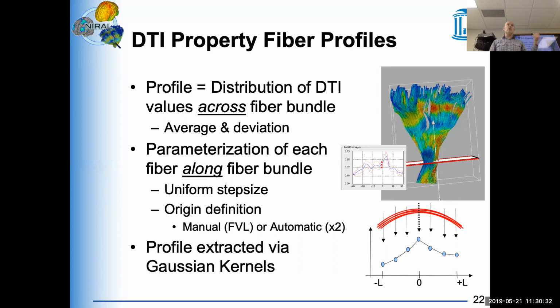We're doing a local Gaussian kernel that basically returns a smoothed representation rather than the exact representation. This just provides a much better, more smooth result. And the size of the kernel, that is something that you can adjust, but the default is pretty decent.